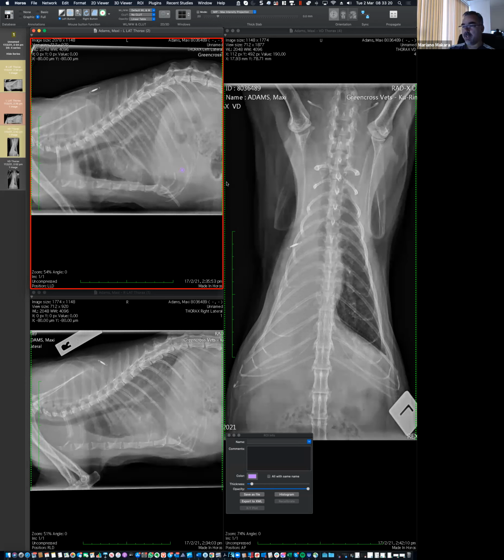I like your comment about contusion. Then I also like your comment about why that is unlikely. No rib fractures, nothing in the wall, no pneumothorax. So it seems to be an extremely severe but isolated finding in terms of trauma. And I really have nothing to say against your comment about could it be neoplasia?